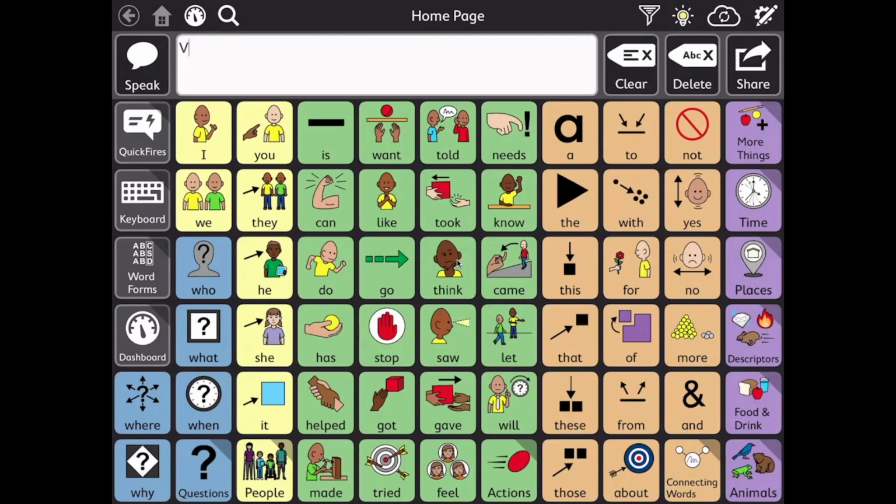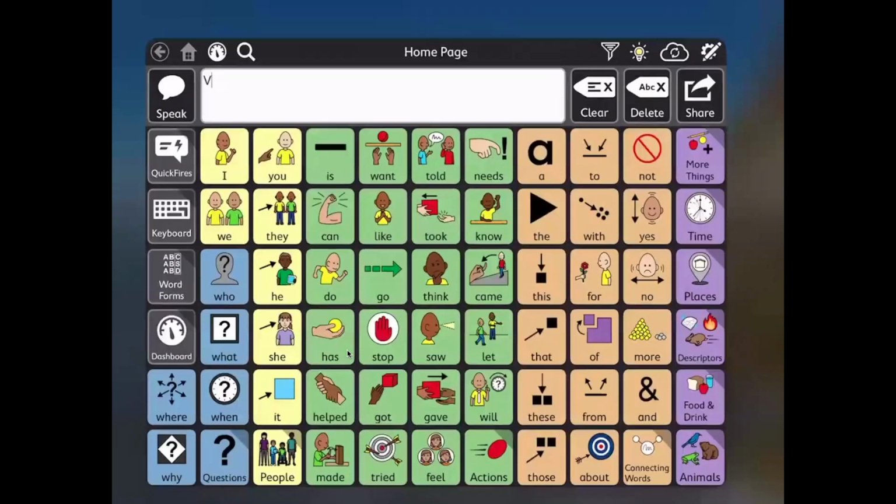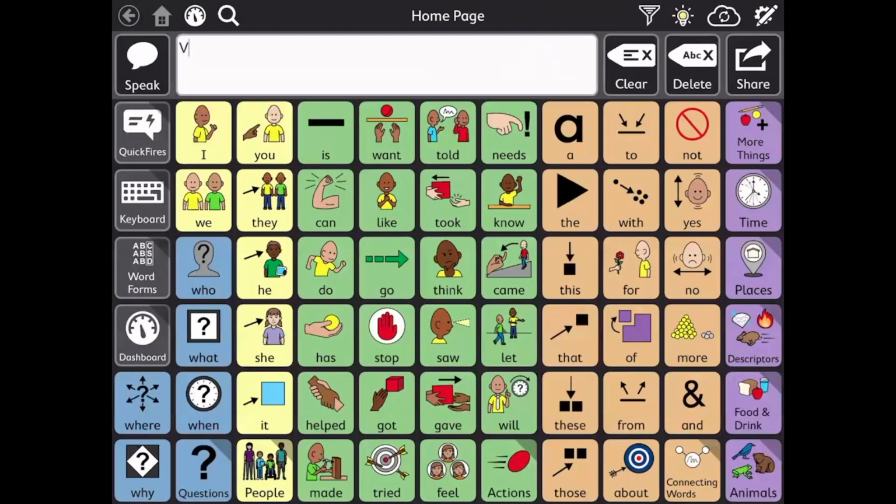But this was a very, very brief overview of the Motor Plan 66. If you have more questions, please let me know. I think one wonderful thing about this TobiiDynavox Snap or TD Snap app, which if we look at it on the main grid or in the App Store, it looks like this. It's a little apple. Is just that there are so many different page sets that you can access. It makes it great for customizing, and it makes it great for accessing all the different features, kind of multiple different platforms. So I encourage you to check it out.